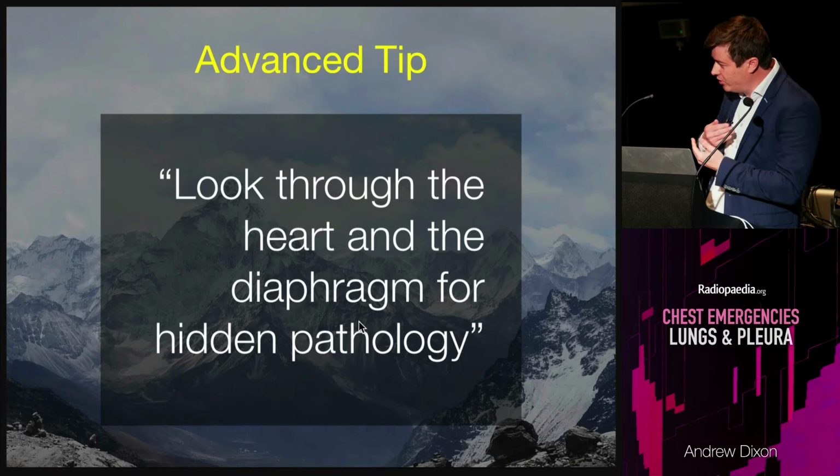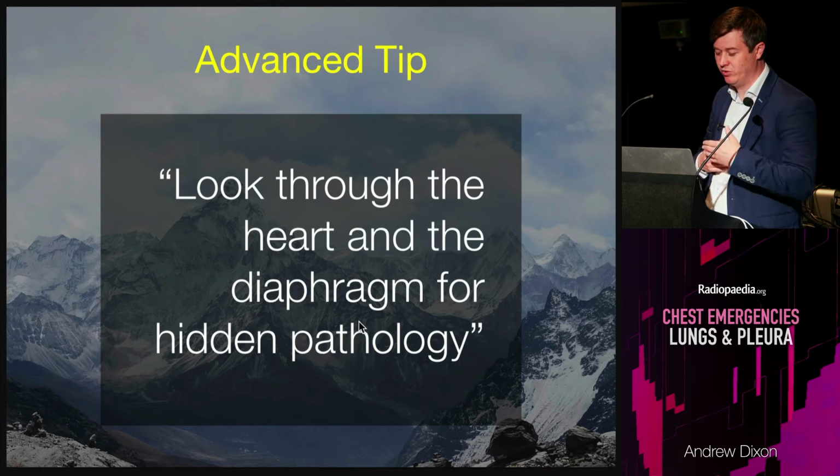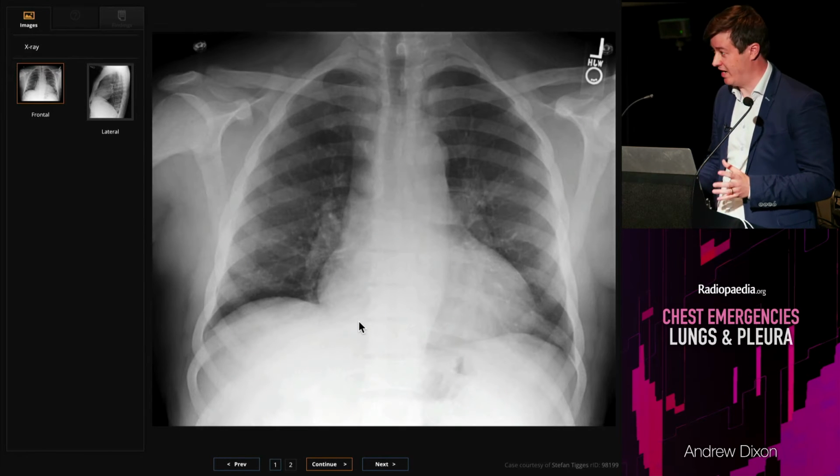So advanced tip, you want to be looking through the heart to spot that loss of vessels, to find that consolidation, looking through the diaphragm as well. Here's an example of looking through the heart and looking through the diaphragm.